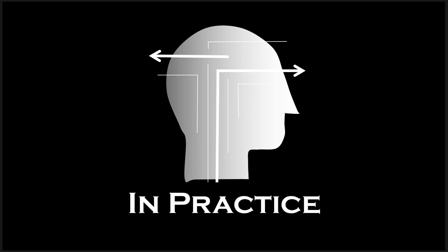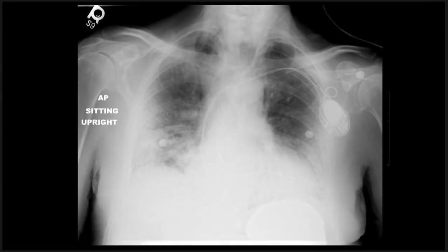Play a little bit more here. Now we've got an older gentleman who has experienced severe chest pain after choking on a Dorito. So I'll take a closer look here, and I want to draw your attention to this region right here. So outline the aorta. There's a little bit of air density there outlining the aorta.